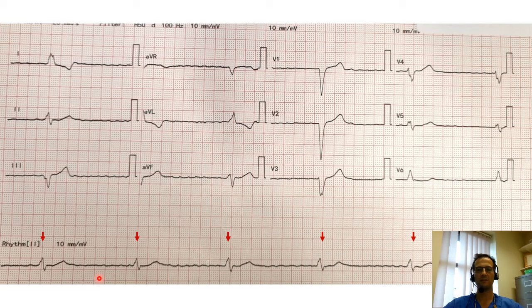And so this needs to be treated exactly as the previous ECG, and it's one not to miss, because if you just say, atrial fibrillation, slow AF, I'll reduce their beta blocker, maybe all will go well, but there is a risk that that patient has an arrest in the meantime because of their complete heart block. So this kind of patient needs to be treated exactly as the other one. Look out for this. Regular rhythm in atrial fibrillation means AV dissociation and means think complete heart block.